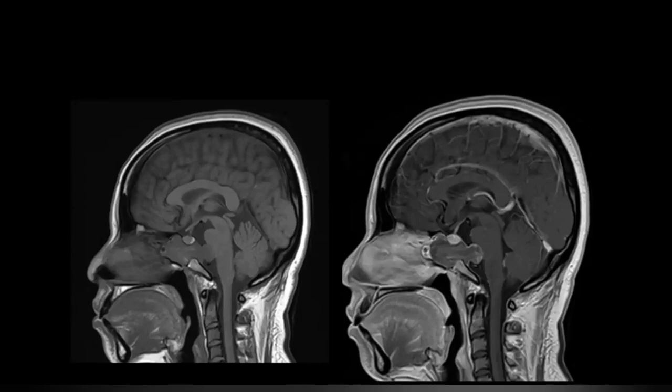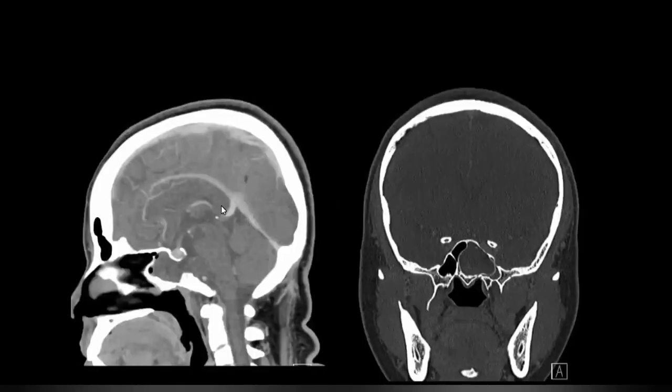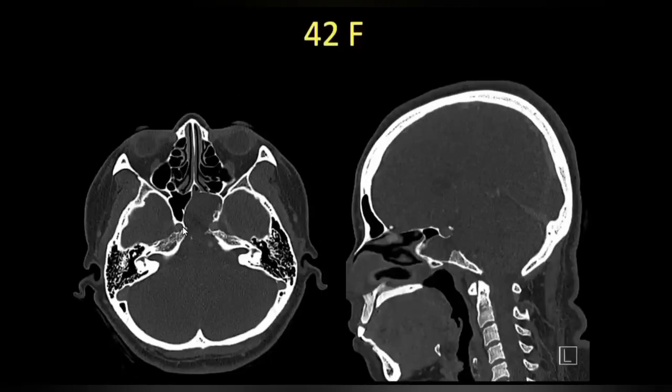So you did well, and I will go a little bit fast through the images because I have too many cases. I just want to share all of them, and all of them have a teaching point. So let me go back to the first CT image. Here the lesion margins are well defined. When the margins are well defined, the clivus lesion can be metastasis, plasmacytoma, lymphoma, chordoma, chondrosarcoma, or some other lesions.